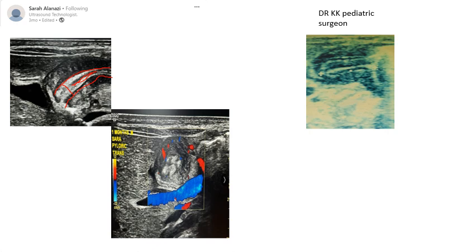Now, she has also used a Doppler to find out that there is a lot of vascularity in the muscle. Of course, the muscle is hypertrophied, so it is likely to have patches of vascularity. This is again from Dr. Krishna Kumar. You can find out this is the hypertrophied muscle with a very small lumen inside.